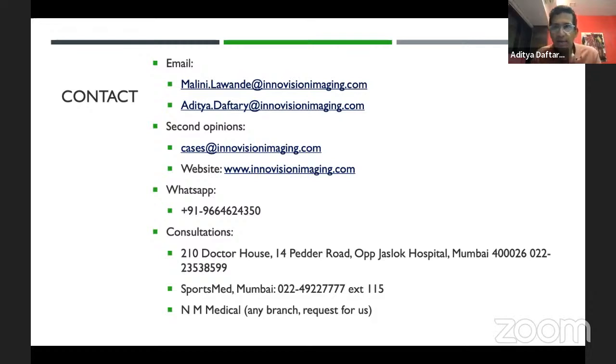Okay. Hi, everybody. Welcome to another evening of this session on knee imaging. We're focusing again just on internal derangements at this stage and on MRI. It's to help you learn how to look at knee MRIs and make sense of what we're looking at, and hopefully help in your practice.